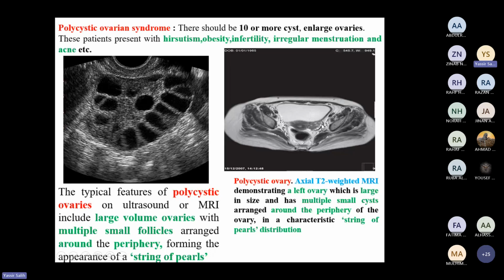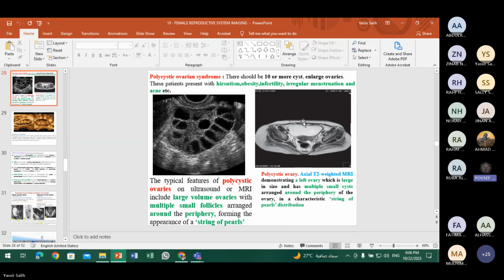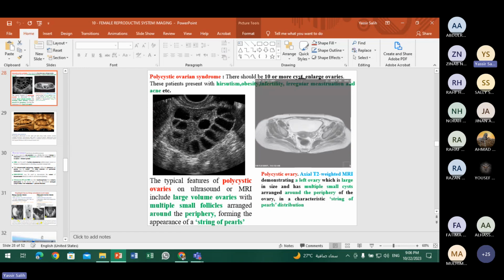دي السيست الصغيرة دي كلها، ده الأوفري كامل كده، ده اليوترس، زي يوترس اندوميتريوم، زي ليفت اوفري. لاحظ إنه فيه سيست صغيرة دي arranged في the periphery في كل الأوفري. طب دكتور ليش صورة هيك يعني؟ ليش يعني من ناحية؟ ما حاسس مثل يعني مضغوطة أو مثل صح. هسه ممكن. بس يعني هي عادي المفروض ما تبين هيك. لا يعني هسه كان عملت لها كده بتبقى ليك واضحة.